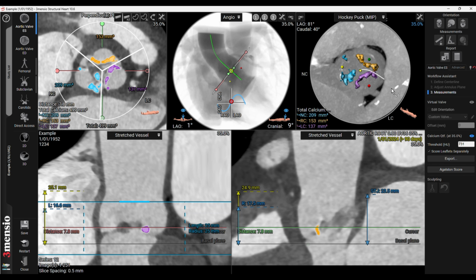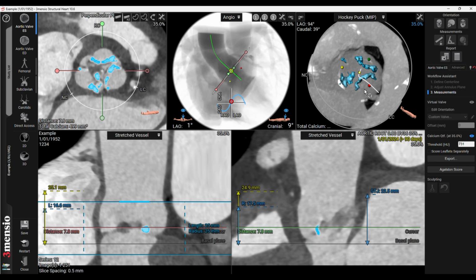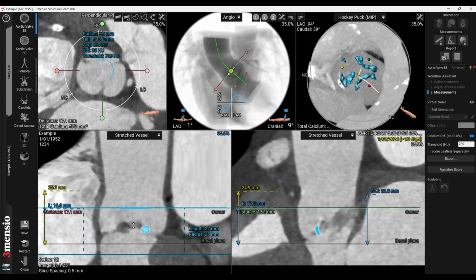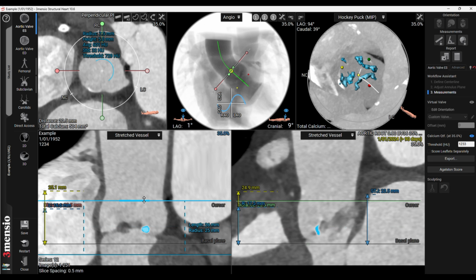And that's really all it is. It's not actually a screening tool in terms of that. Just making sure that you're also aware that you can negate this score by how much you include or exclude. So you can increase or decrease it by adjusting those blue lines. So you have to use it with caution. And if you're doing it yourself, that's okay. But if you're getting the reports of other people, it's best to just take it at face value because obviously it can be manipulated. And seeing that little bit there is taken out from the STJ, it's just a great guide.